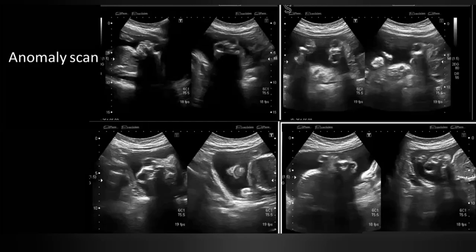And a few other images are taken from the anomaly scan. When we look for the fetal head, we don't see it. We don't see the cranial vault. I'll show you. We don't see the cranial vault. We only see the eyeballs, the frog-like eyeballs, and we don't see the brain or the cranial vault. So this is a case of anencephaly.